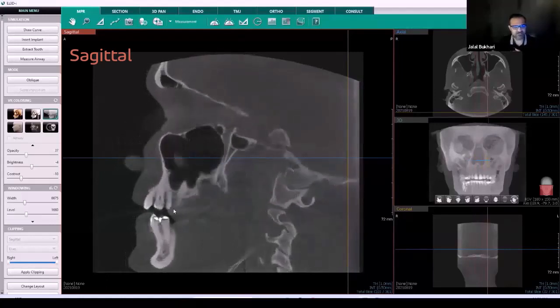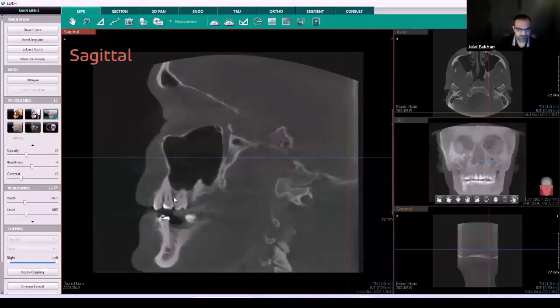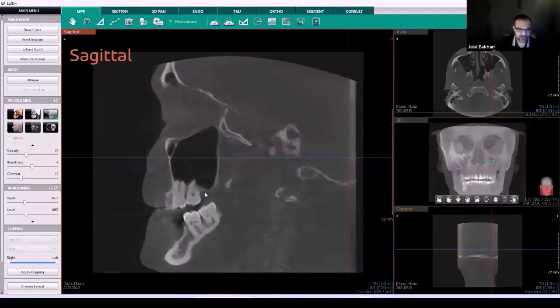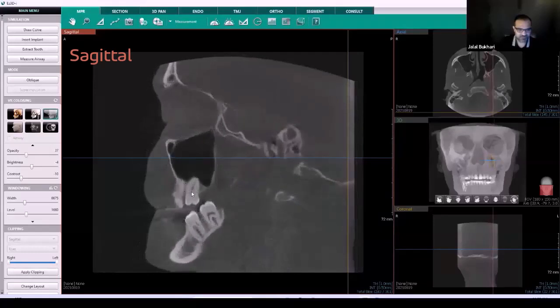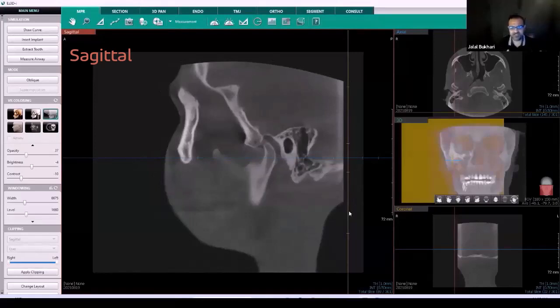I typically like to start the same way for each tooth. I start from the outside, so I'm looking at the crowns and the portions of the pulp chamber, and then moving my way inwards towards the pulpal system and the periapical regions. I'm looking for any type of pathology that may be associated with these structures. It varies from practitioner to practitioner, even from radiologist to radiologist.